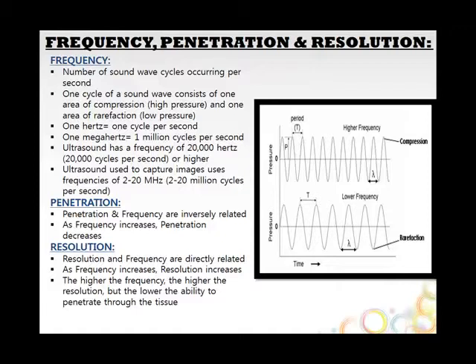Usually between 12 and 14 megahertz, most commonly. Yep, so we use a linear transducer, and we use a high frequency transducer. On the market today, there's transducers between 2 and 20 megahertz. This is what they sell out there. When you get too high of a frequency, you lose your ability to penetrate.